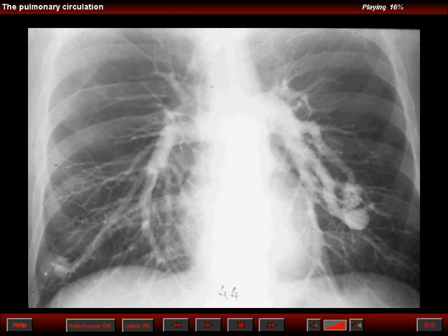This patient had bilateral pulmonary nodular densities. Both were related to macro arteriovenous fistula that are well delineated in this pulmonary angiographic examination.